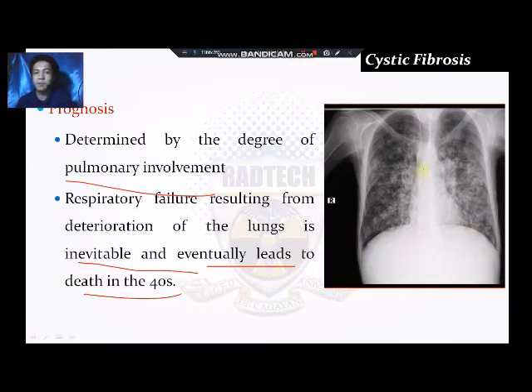If normal ang lung fields atong patient, supposedly these are all black. Black lang ang appearance, and almost the whole of the lung fields should appear as black. But because of the condition of the patient, because of the mucus plugs, daghan kay nagputi-puti diri. Fluid will appear as white on the radiograph, radiopaque. So if mucus formations are accumulated within the lung tissues or the bronchial system of the patient, they will appear as white, radiopaque.